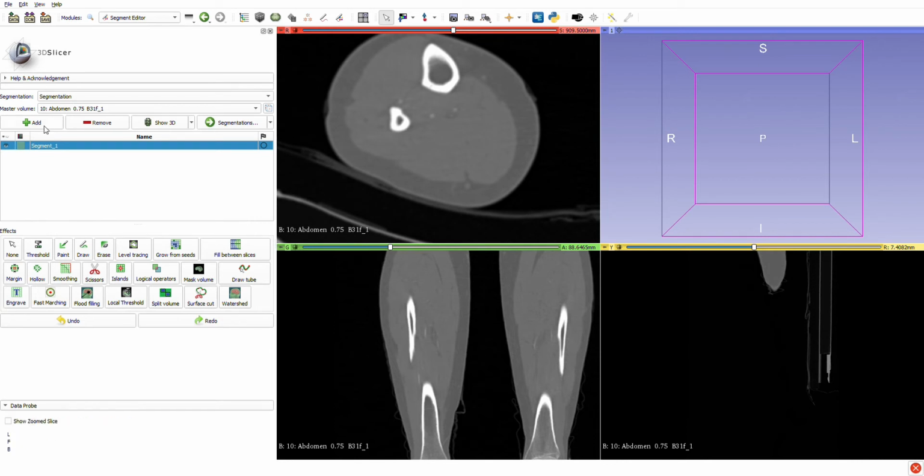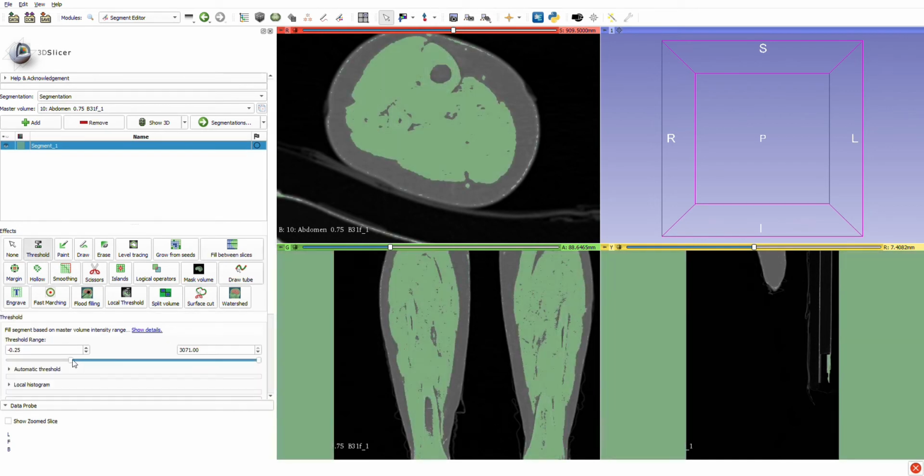So you load the DICOM data into 3D Slicer. Over here you can change the name of your patient and what organ you segment. Because of the GDPR, I will fill this in later while I'm not recording, but for now let's call it Segment 1.